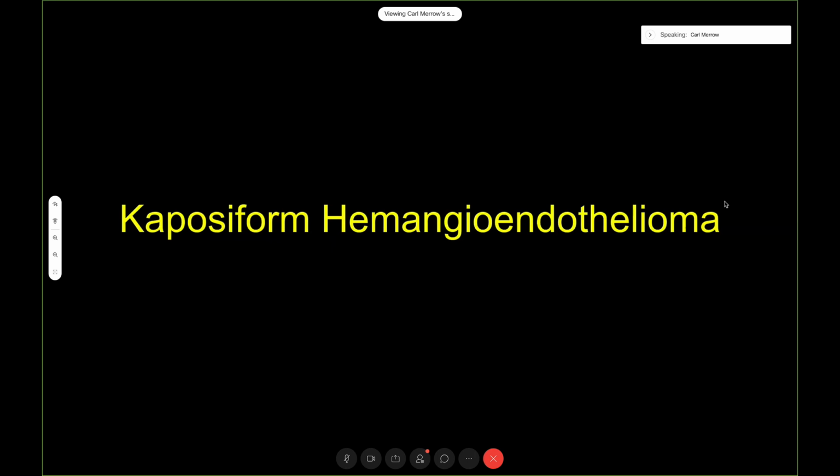And basically on the ultrasound, the differential was given between a Kaposiform hemangioendothelioma and a congenital hemangioma. But infantile, you really shouldn't. And this was on ultrasound. It was going basically from the dorsum into the palmar soft tissues, and that really should not happen with the infantile hemangioma.